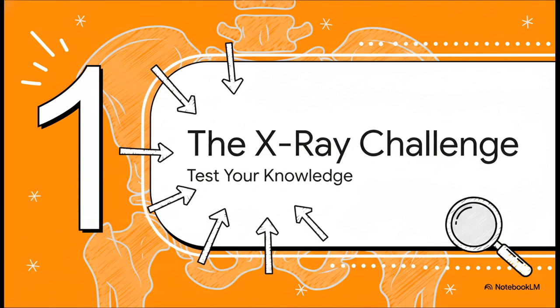And here's exactly how we're going to do it, with the X-ray challenge. This is your chance to really play along. I'll show you an X-ray, point to different parts, and your job is to name them before I reveal the answer. Let's see how you do.